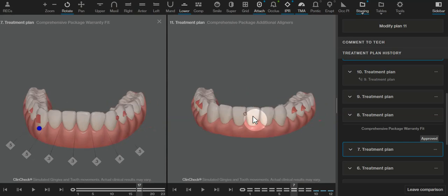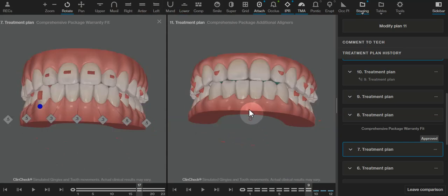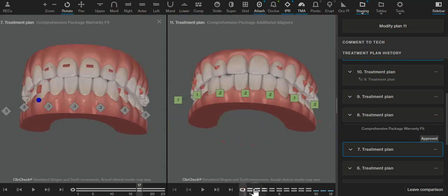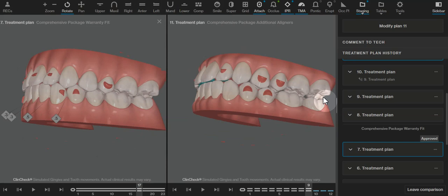And then when we do some slight retraction as well to close the spaces between the lower anterior teeth, that pulls those teeth away from the upper teeth. When we relieve the interference that was caused here, the rest of the teeth should come together.